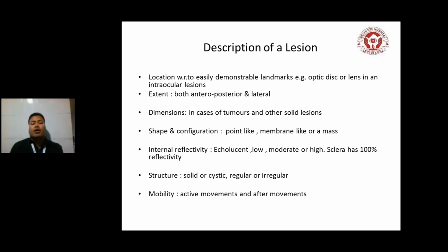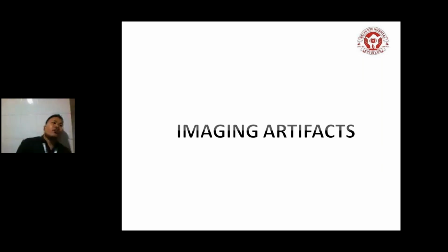And to differentiate, we have to do a kinetic scan for the mobility. Sometimes we get confused in recognizing lesions because of imaging artifacts. Actually, there is no pathology, but it looks like something is wrong in the scan.